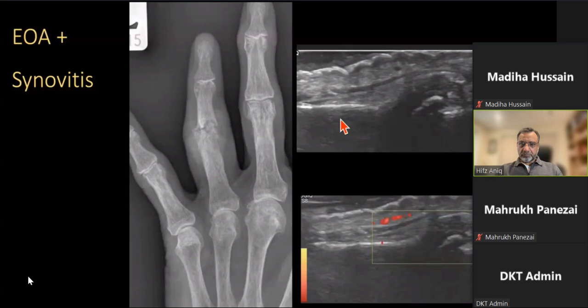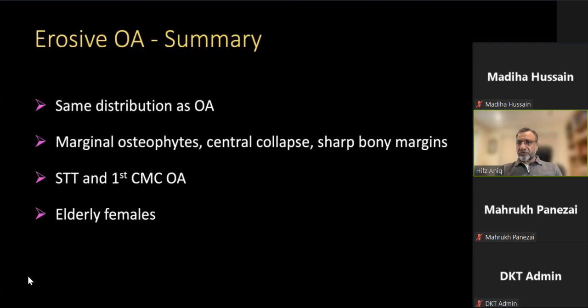Okay, this is how it would look in these cases. I don't want to add or reduce anything, plain X-rays are the hallmark of diagnostic priorities.